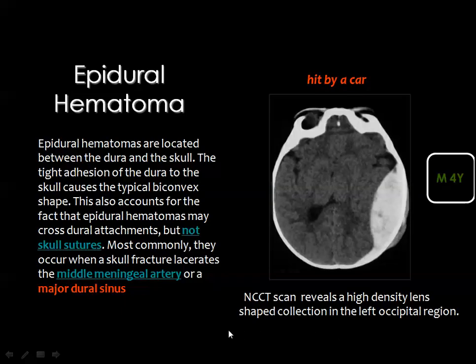And this is an epidural hematoma in a child hit by a car. You see the typical appearance. There is a convex inner margin, and it is intimately related to the inner skull table, and is associated with a minor degree of subgaleal hematoma.